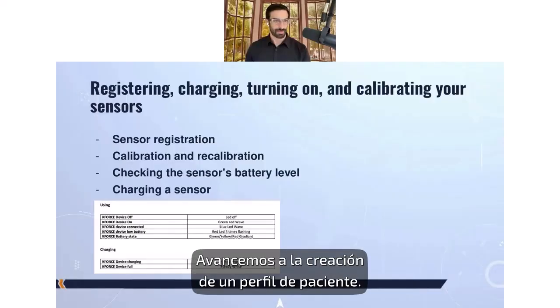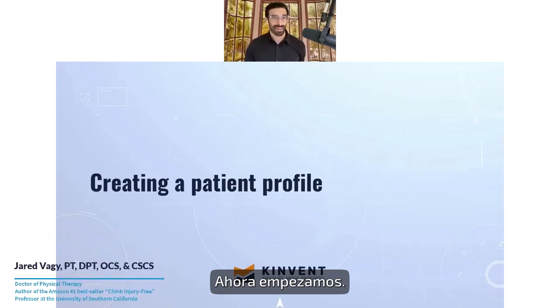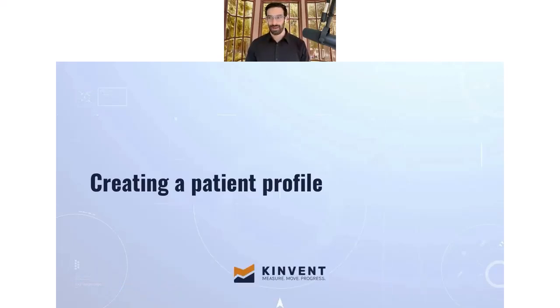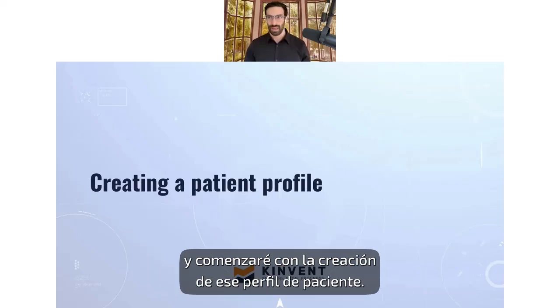Let's move forward. Creating a patient profile. Now we're starting. You have everything registered. You have your devices ready to utilize. Now we have to get our patient profile set up. So this is the process. I'll go ahead and share the app with everybody in a moment here and start to show how to create that patient profile.